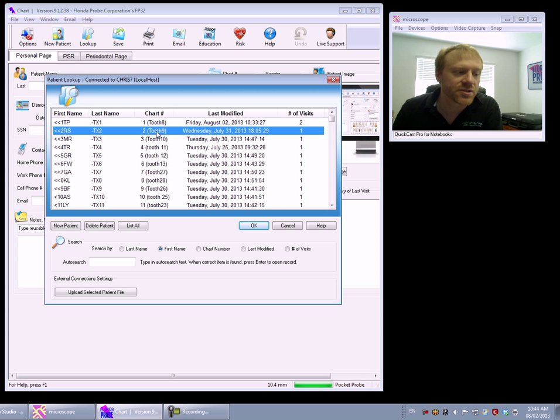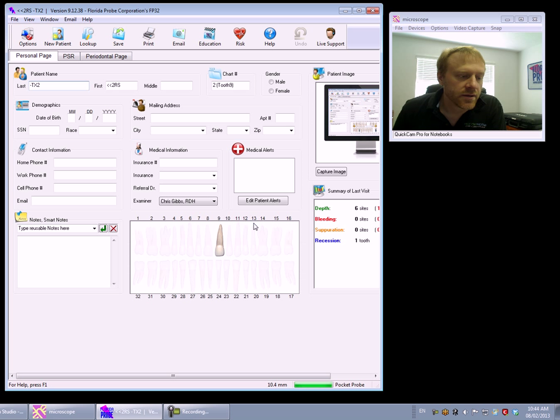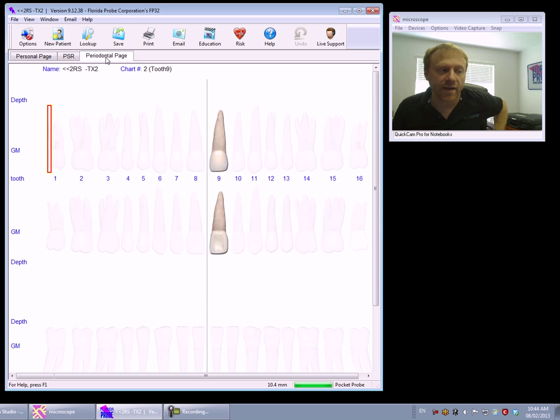So we have patient number 2 that's come into the office today to get their 3-month follow-up chart. And so to select them from the list, we could just double click them directly here from the list, or once they're selected you could just click the OK button. So it's going to bring up the patient. For this patient, we see that tooth 9 is the one that we're going to be recording. And to start the actual charting visit, we're going to click on the periodontal page tab.